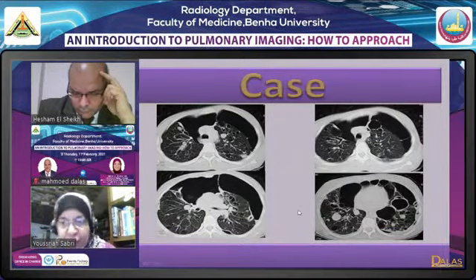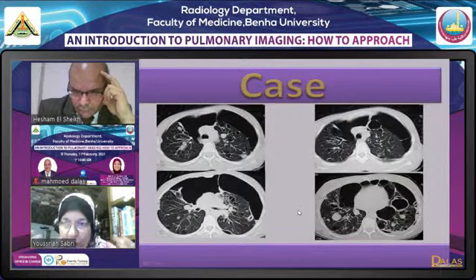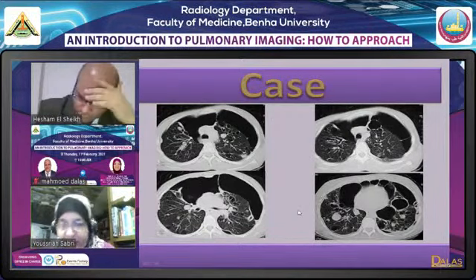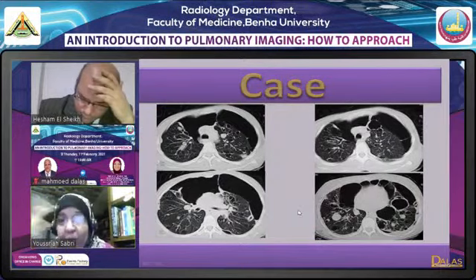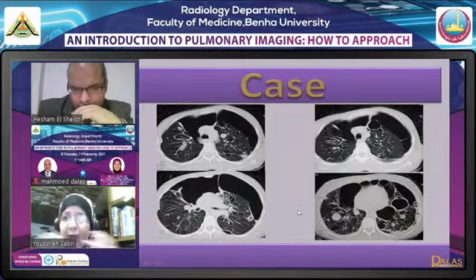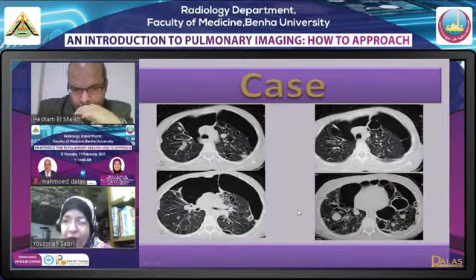sometimes it is difficult to differentiate. So I stick to all the points. بدور على distribution. لو لقيت الليجن اللي انا بتعامل معاه upper lobar predominance يبقى انا في سكه الانفيزيما. لو الليجن diffuse يبقى انا في سكه ان انا مش متاكده من الوول بس الليجن ده diffuse وابر ولور وبنفس الدنسيتي وبنفس الانتنسيتي ويبقى انا بتكلم على لام. زي ما بقول لحضراتكم عشان افرق حاجه من حاجه ما ببصش على نقطه واحده، ببص على الحدوته على بعضها. انا ده له وول، طب انا مش متاكده ان في وول، طب في ديستريبيوشن وفي جندر بريفرنس، كل ده بيتحط مع بعض.